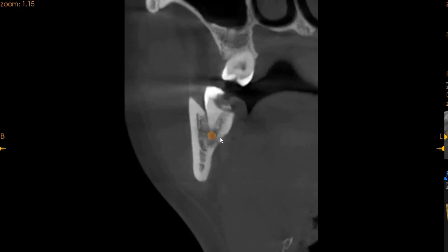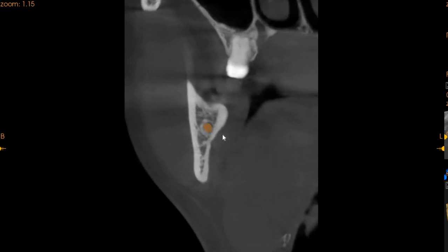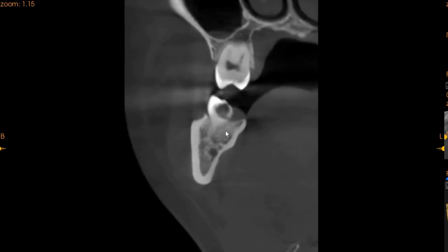the nerve canal gets compressed, and it is right in the middle of the root. And then as we move further distally, we can see that the canal regains its architecture. Now, for better understanding, we are just going to remove the highlight and we're going to take you through the mesial to the distal aspect one more time. So for our kind doctors, I'm going to zoom in.